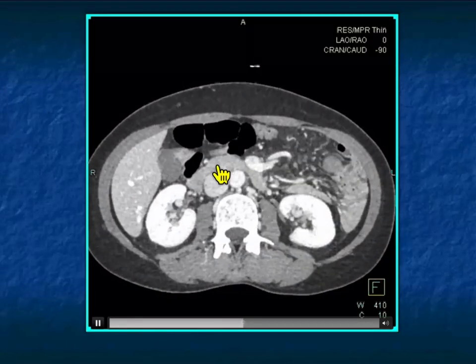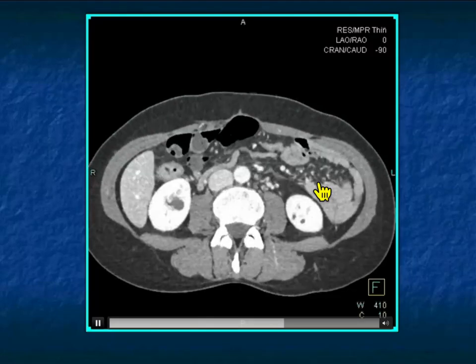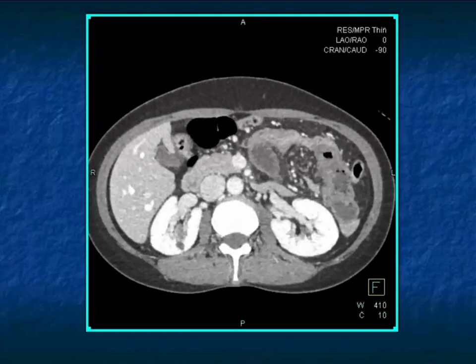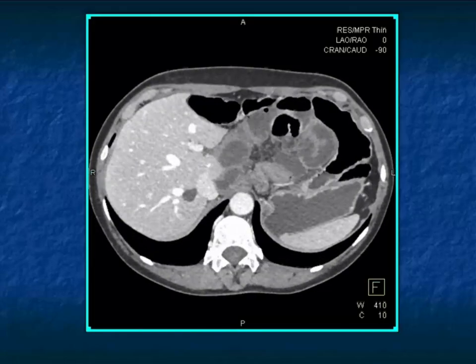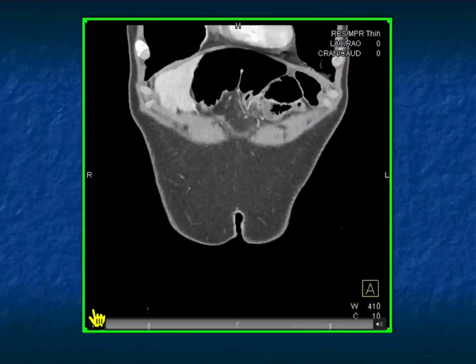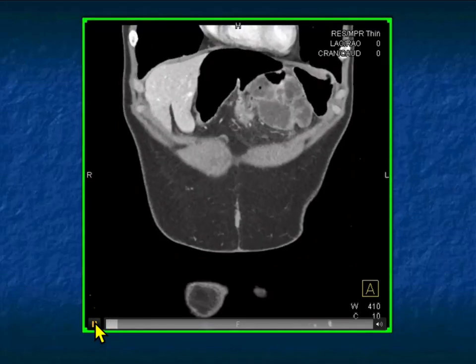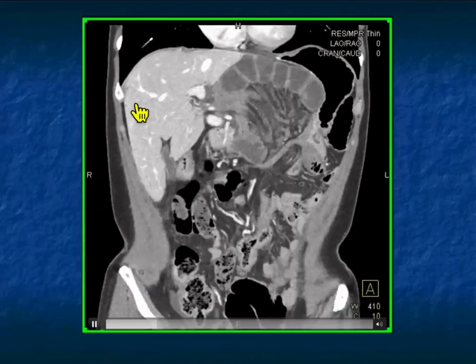Small nodes are present. You look distally, you have normal bowel enhancement, but when you go back proximally, you see that the bowel loops really are not enhancing. That's an internal hernia with a closed loop obstruction. And again, it's easier to see at times on the coronal view, though I thought it showed very nicely there axially. But look at the loops of bowel here.